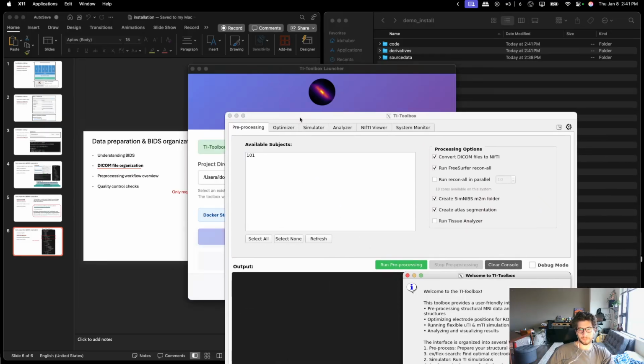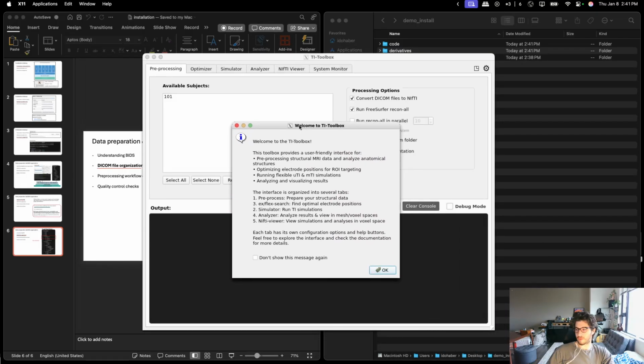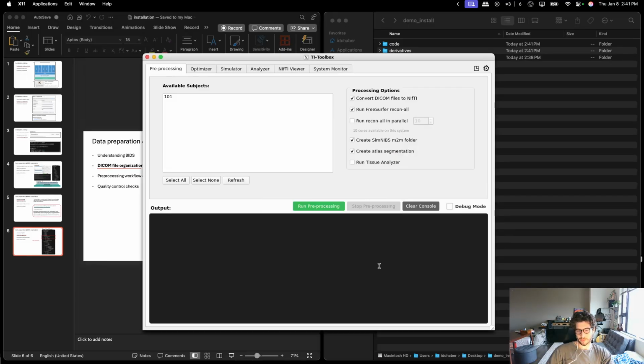And here we go. It recognized that this is a new project, not necessarily a new user, but every new project that you start will give you this welcome message. I don't want to see this anymore, so I'll say okay.